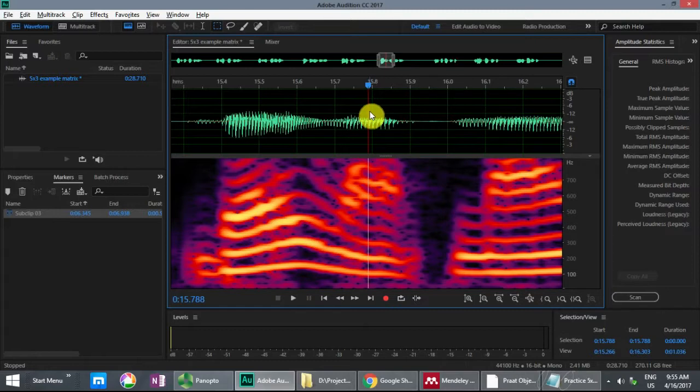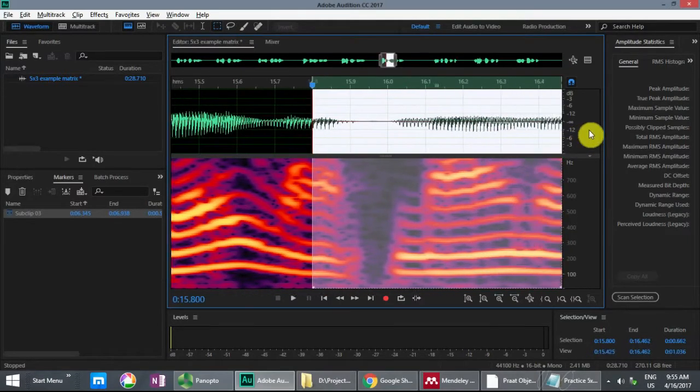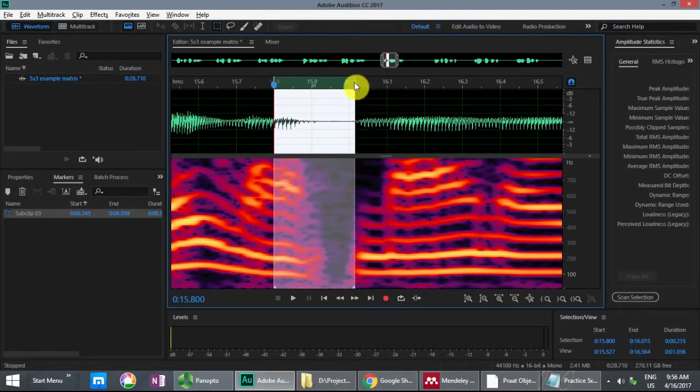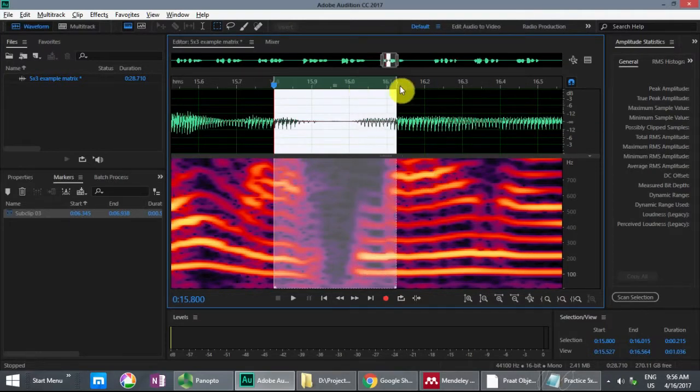And if I can remember correctly, I edited right around this point. So now I'm going to select from here over to a place in 9. And this is where you need to simply identify a consistent landmark, but it's helpful to have a rule of thumb. So one rule of thumb would be to edit right in the middle of the voiced consonant. So you can see that the voiced consonant probably starts here and goes to here. And so I could just shoot for the middle point there.